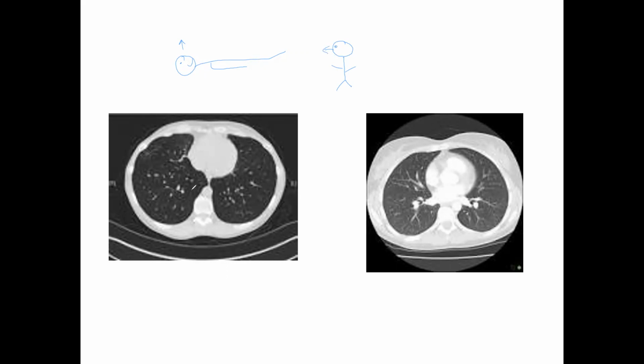So if you look at this CT, this should be the patient's left lung, the patient's right lung. This is their back. You see the spinous process there. You've got the sternum there. Relatively decent looking lung fields on both of these.